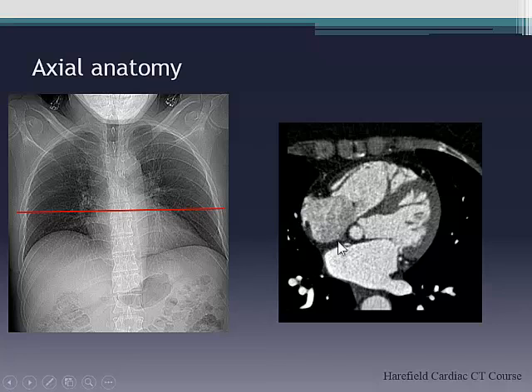Here you can see the interatrial septum, and if you measure the Hounsfield unit, or the pixel intensity of this, you'll see that it's fat. So CT is a very good way of identifying, for example, if you've got interatrial fat hypertrophy. And as you know, sometimes you can get confused as to whether there's a mass there or not. If you don't have easy access to MR, you can nail it on CT quite readily, because you'll be confident that it's fat.